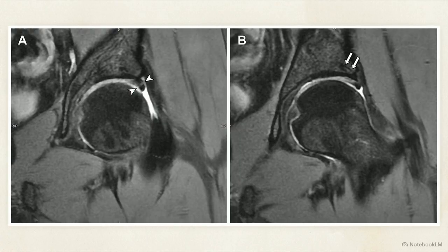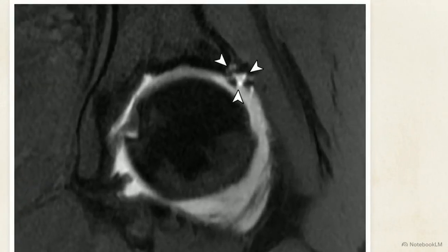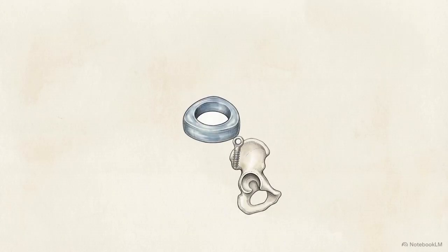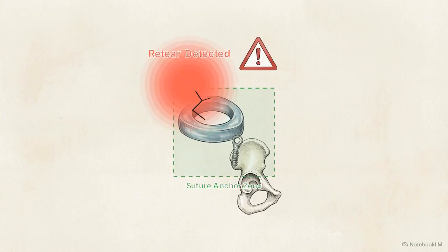To diagnose a true re-tear, radiologists look for different markers. This MRA demonstrates structural distortion of the anterior superior labrum, accompanied by bright imbibition of contrast material directly into the labral substance. Re-tears are also suspected if the tissue defect extends beyond the original suture anchor zone, or if the abnormality is larger than the margins of the primary tear.